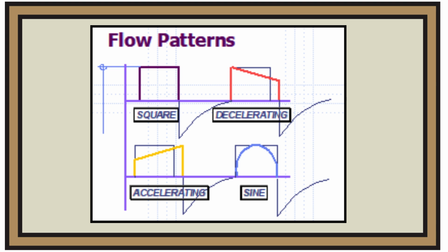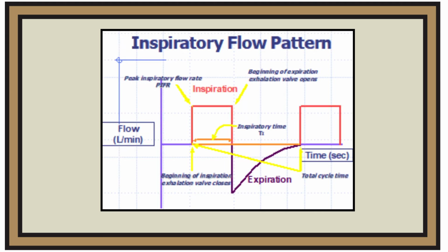Most ventilators allow clinicians to select a flow pattern that is most suitable to the patient. Observe that in each flow pattern illustrated in this frame, the maximum flow rate is the same and inspiratory time varies. This slide shows initiation of a flow at the beginning of inspiration, and also it shows the initiation of expiration.